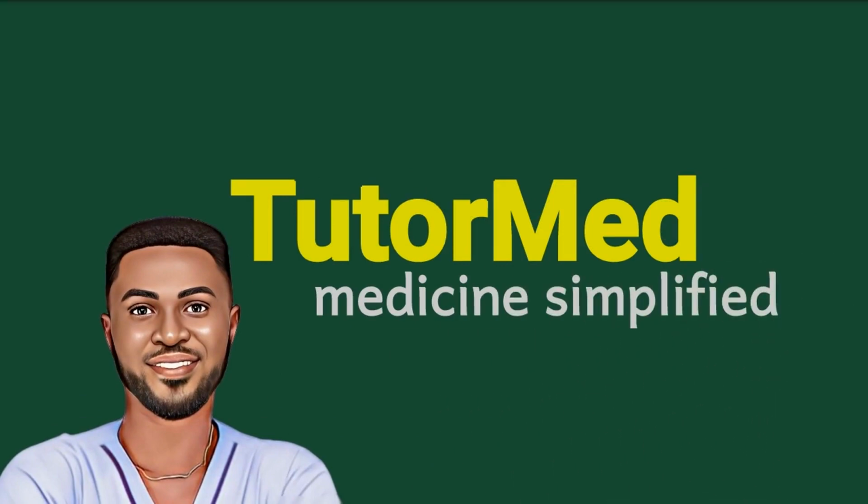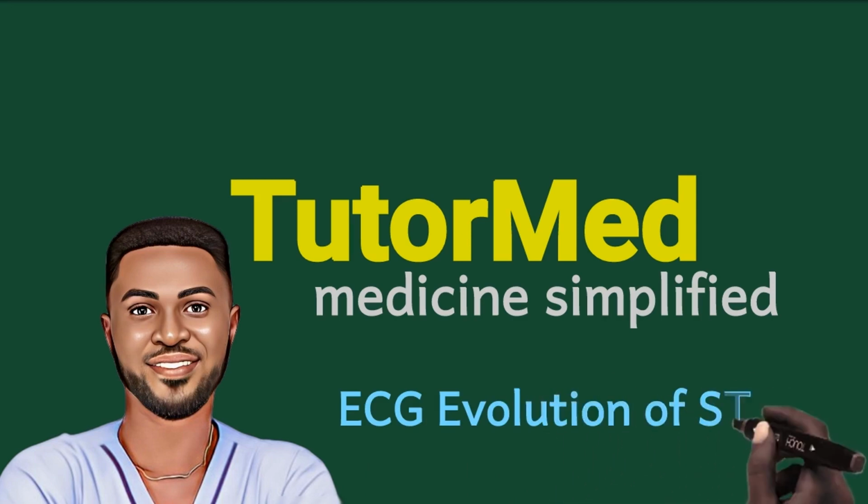In today's video, we want to discuss the ECG evolution of STEMI. This will illustrate the various ECG changes that can be recorded when a patient gets STEMI.